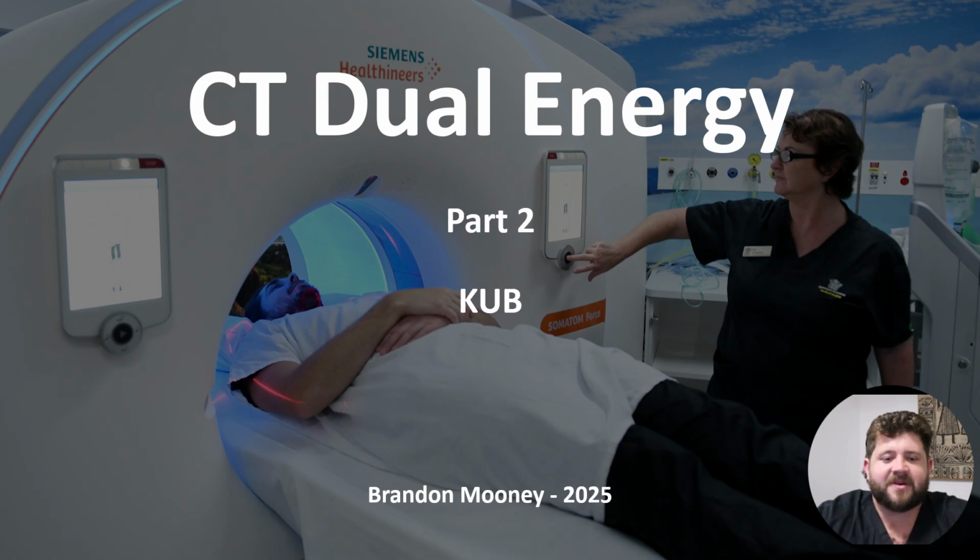Hello and welcome to this Dual Energy KUB training video, specifically for the Siemens Somatom Force and the Syngo.via Dual Energy workflows. In this session, we'll work through when and why we perform Dual Energy KUBs, how to acquire them correctly, and finally, how to perform the post-processing and stone characterization on Syngo.via.